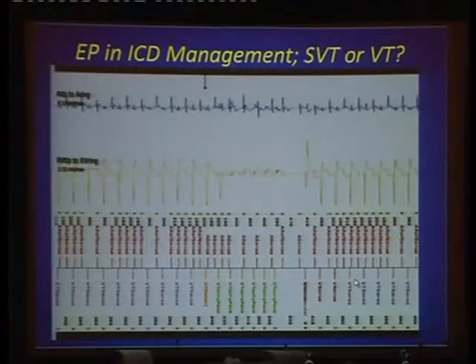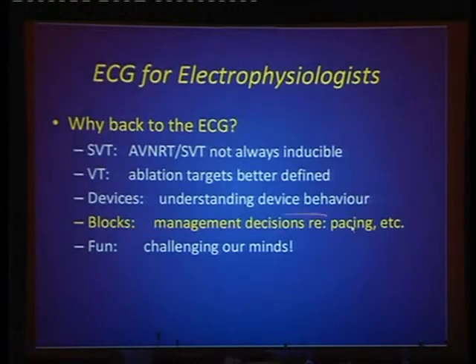Diagnostic of an atrial tachycardia. This isn't VT, and you even know what kind of tachycardia it is. So, a beautiful example of how studying the ECGs and the electrograms brings us to the correct diagnosis. Blocks.